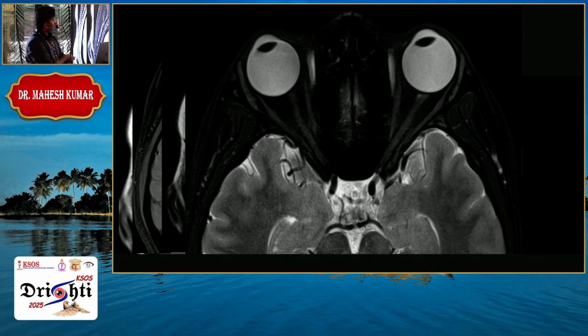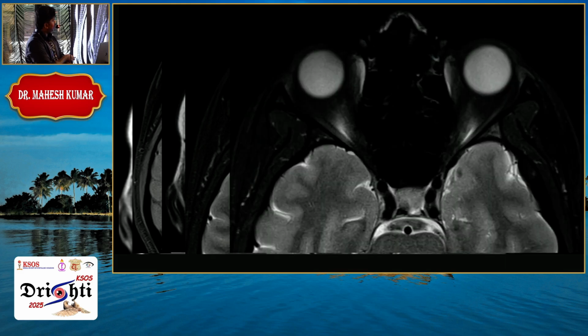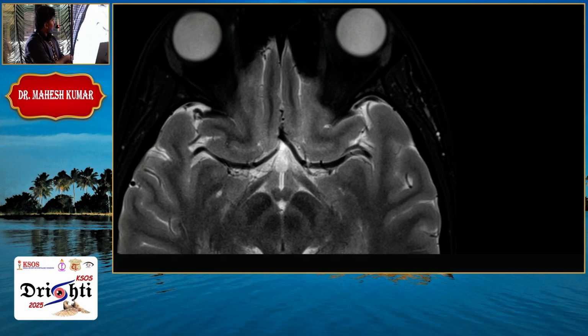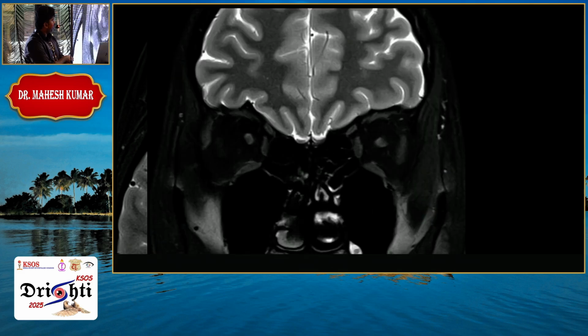in the optic canal, and they go into the chiasmatic region. In the next upper section, we have bilateral symmetrical cavernous sinuses with the internal carotid arteries. And in this, we can see the X-shaped optic chiasma forming. And posterior to that, here we have optic tracts that continue as optic radiations.